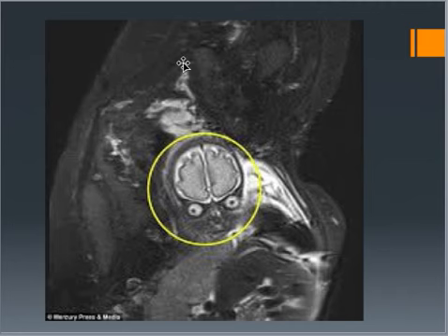This is a pregnant mother. Imagine seeing that scan come up. So you've got the little baby's brain, the eyes, nose, and the little mouth here. It's really neat to know that we can image that, but when that first pops up, you're like, oh, it's kind of creepy.